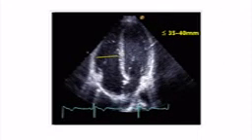Do you think it's difficult to assess right ventricular size and function? Well, sometimes it is, because we also have less impressive cases. But to make a diagnosis, you have to memorize 3 points. Look at the size of the ventricle, assess function, and look at the interventricular septum. When we talk about the size of the right ventricle, we mean that you have to measure as we showed you in the demonstration, and the measure has not to be above 35-40 millimeters.